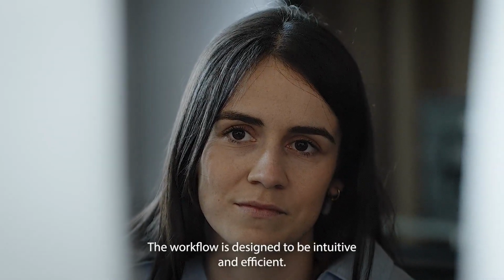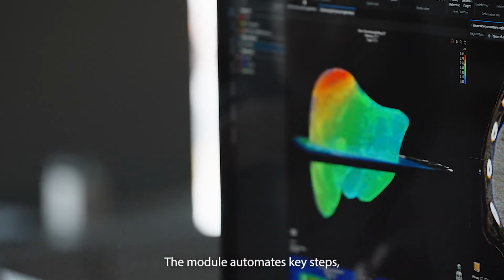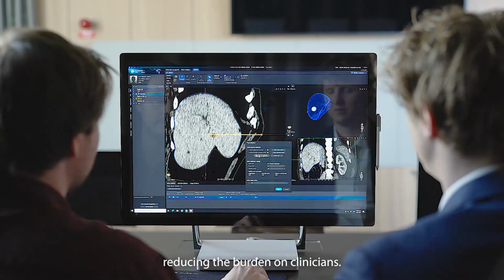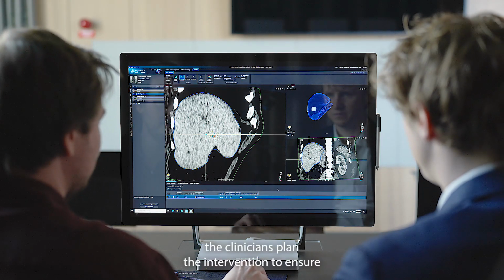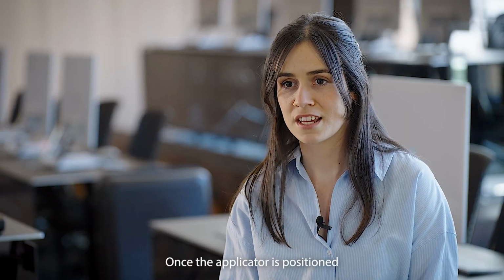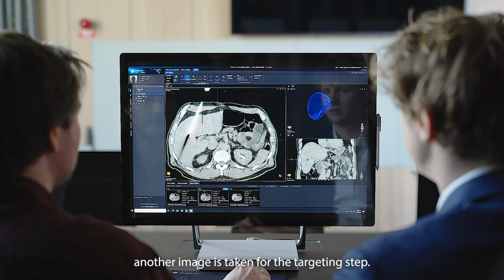The workflow is designed to be intuitive and efficient. The module automates key steps such as segmentation and image registration, reducing the burden on clinicians. In the planning step, the clinicians plan the intervention to ensure total coverage of the tumor and its margins. Once the applicator is positioned, another image is taken for the targeting step.